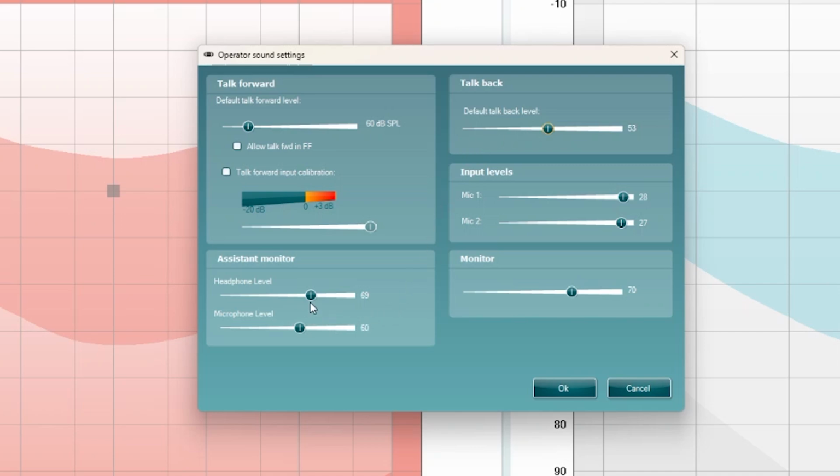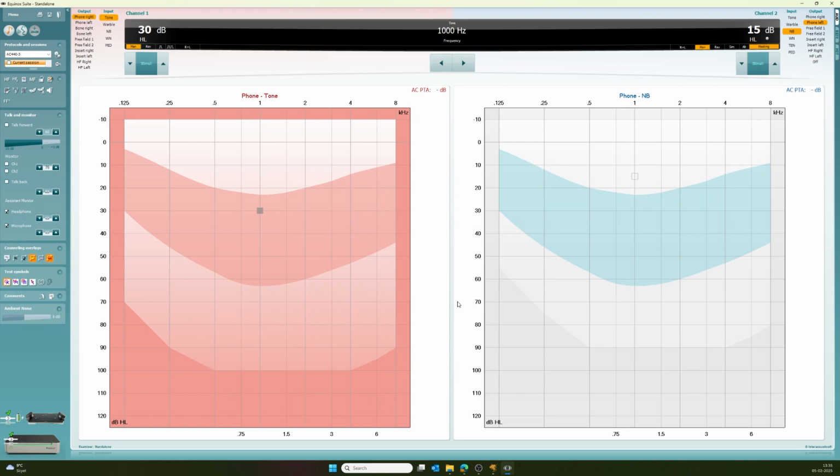Once the changes are made and saved, these settings will be the default values each time the suite is opened and ready for use. You can always use the adjustment settings on the front page for easy modifications during the measurement.